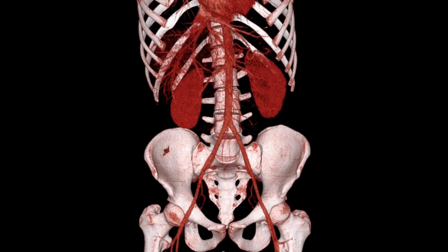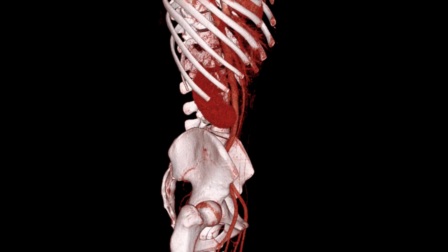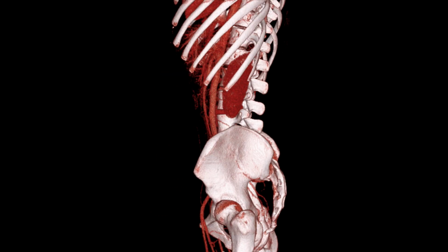Sometimes doctors need to focus on the blood vessels or bones, so they use an image like this. Imaging programs are so advanced nowadays that they can make 3D images based on the transverse slices acquired by the machine.